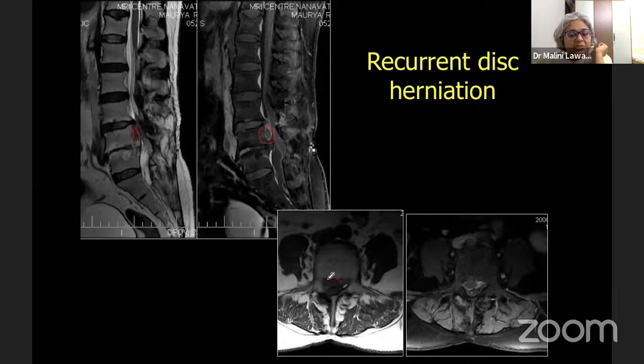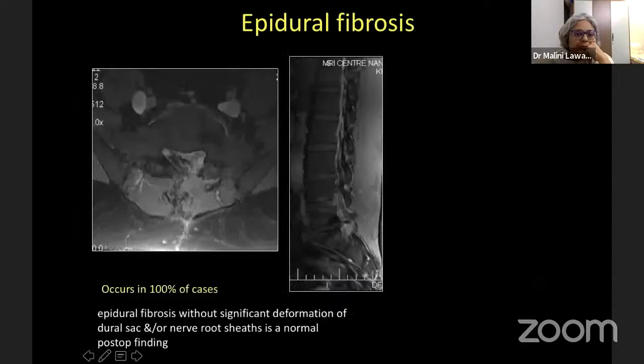These are the axial images. This is T1 weighted image. This is the disc herniation. And this is the thecal sac here, which is getting compressed. And here you can see this disc herniation is showing peripheral enhancement. This is because the disc is avascular, so it does not take up the contrast. Only peripherally, some contrast will be imbibed. And that's the reason we should do the scan immediately after injection. You should not wait for longer after injecting contrast, because with longer time, contrast diffuses inside, and even a disc may show some enhancement.